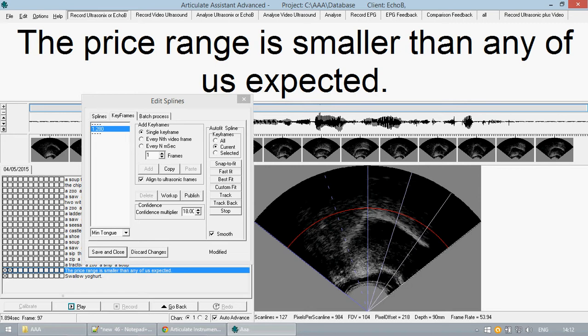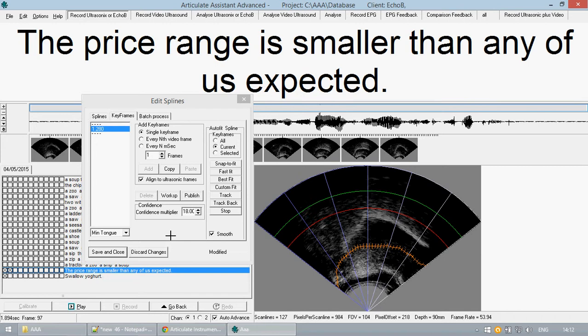The layout of this tutorial will follow a slightly unconventional format. Because the software regarding batch processing of Splines is relatively new, I will have to explain some things which you must do to ensure that your data is correctly batch processed.